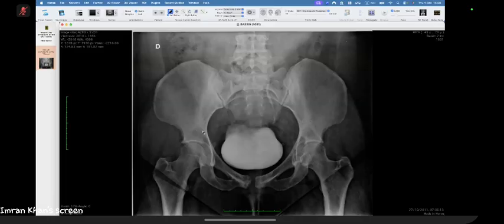So coming back to the findings, these are multifocal, small-sized lytic lesions involving the said regions. If the patient is of older age, my top differential with these deposits would be metastasis if there is a known malignancy, since these are lytic.